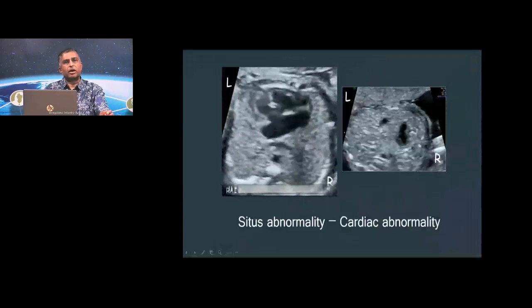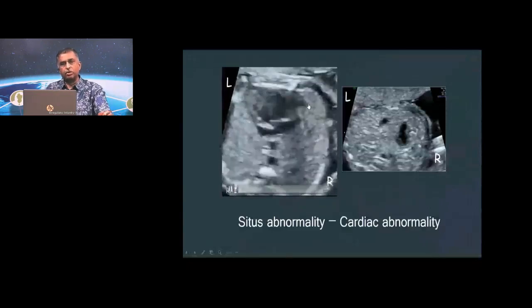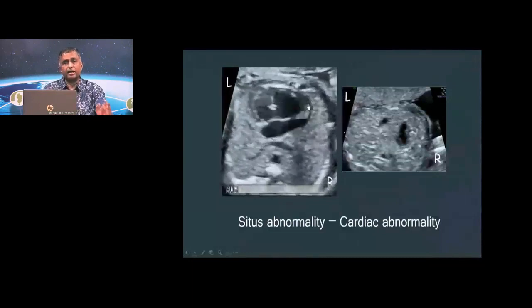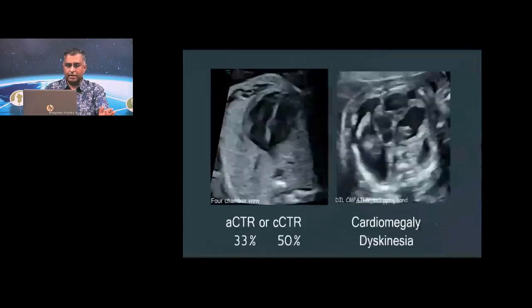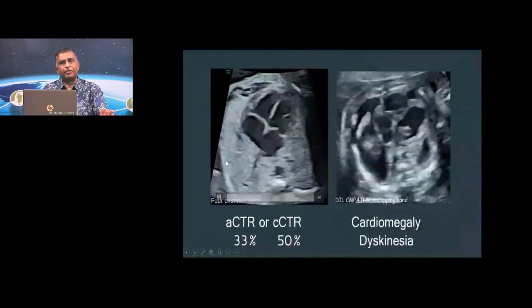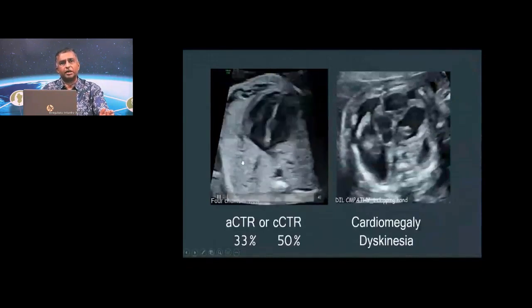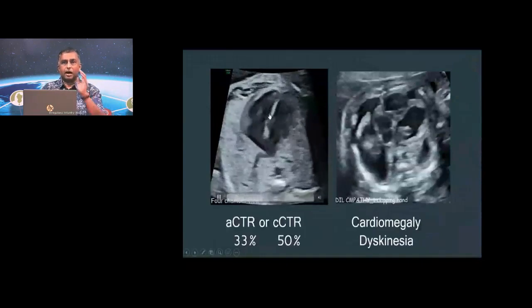And all this, you had already your clue in the abdomen before you came into the thorax. So that is why please start with the abdomen. Please start with situs. Extremely, extremely important. The size is important. The normal heart occupies about 1/3 the area of the thorax. So 1/3 right lung, 1/3 left lung, 1/3 is the heart.